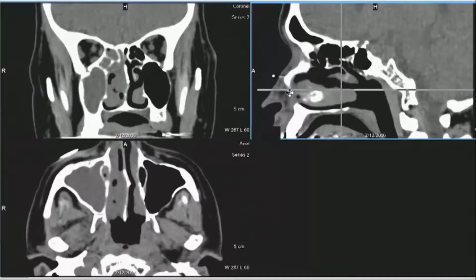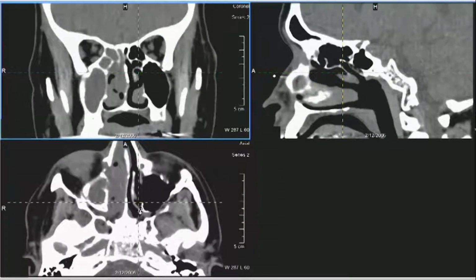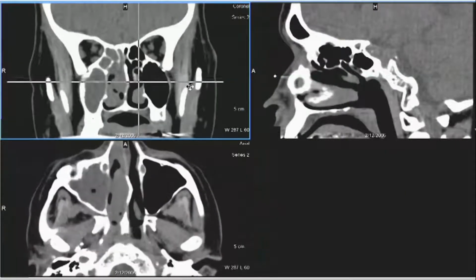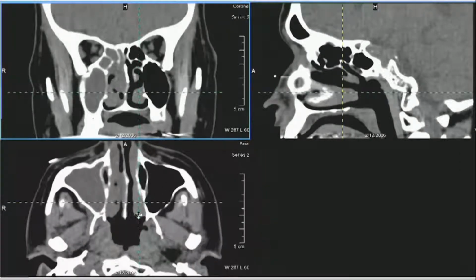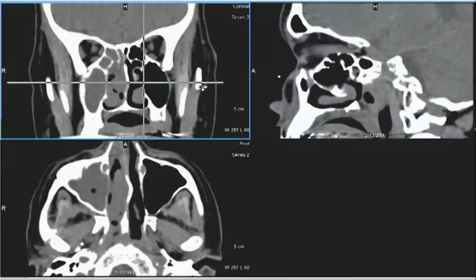The next checkpoint on the sagittal images also includes the pterygopalatine fossa, which in this case appears to be obliterated on that side, compared to the other side. Sphenopalatine foramen, some distal branches of the maxillary artery there, but clearly infiltration of the pterygopalatine fossa by way of the sphenopalatine foramen. Another checkpoint in the search pattern on the axial views, and the last checkpoint being the nasopharynx, with a possible suggestion of fullness in the nasopharynx on the right side compared to the left, although not clearly definitive.